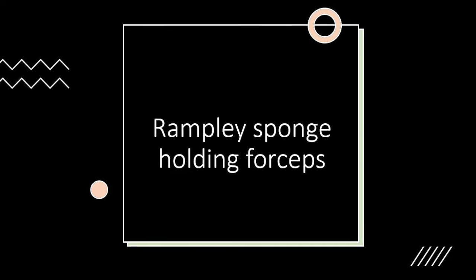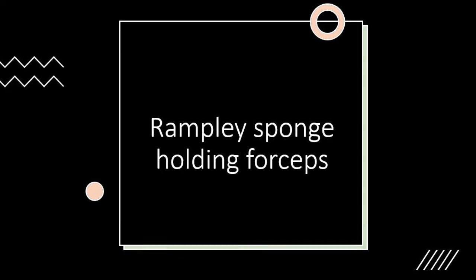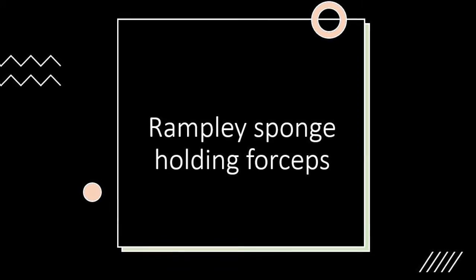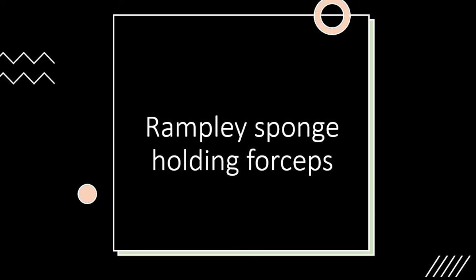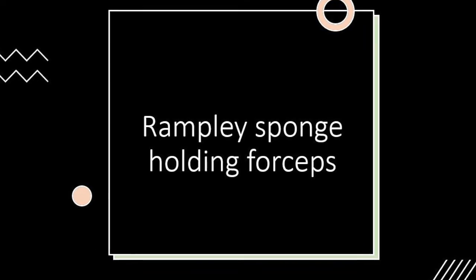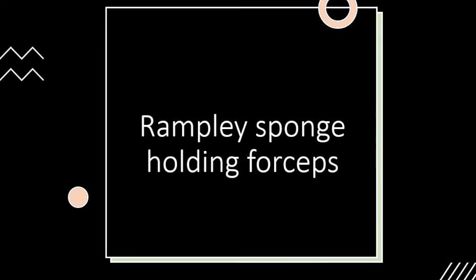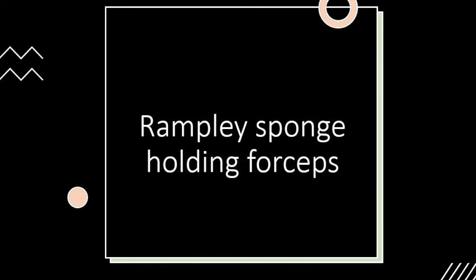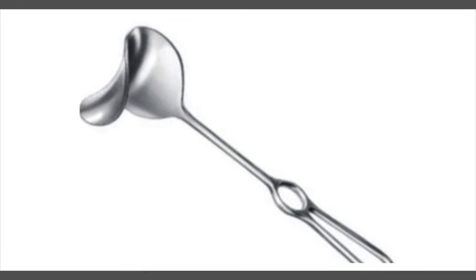Now this is used, for example, to hold on to the membranes after delivery of the placenta at the time of C-section or even after vaginal delivery. It's used for various different reasons, but that's one common reason that comes to mind. Okay, this is our next instrument.